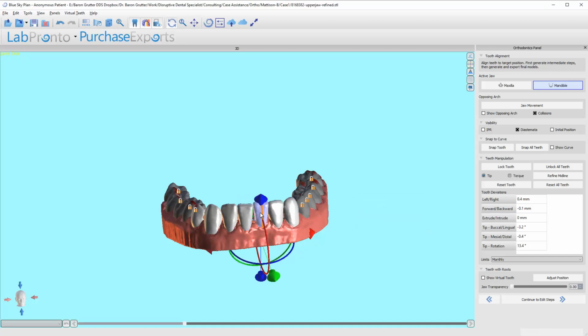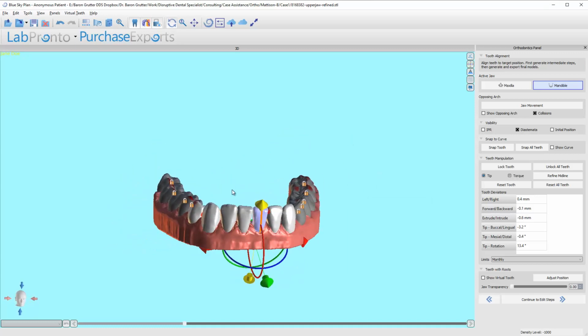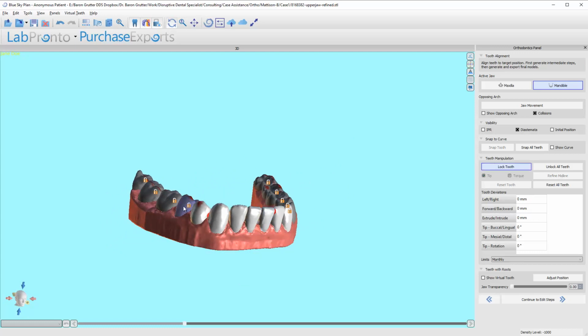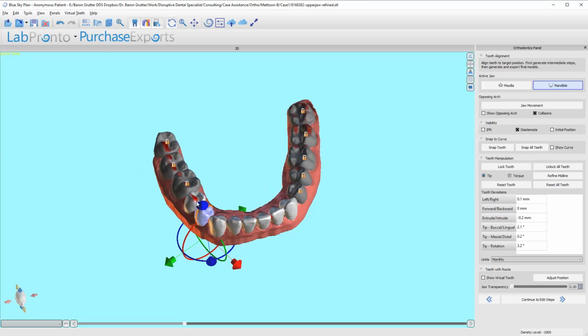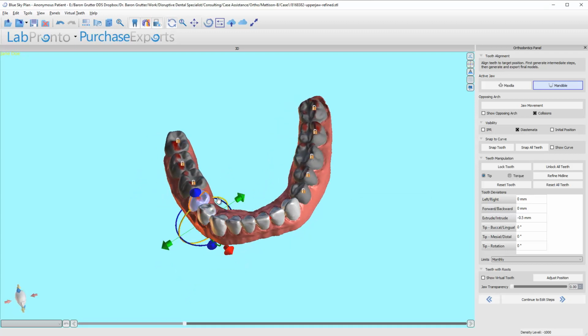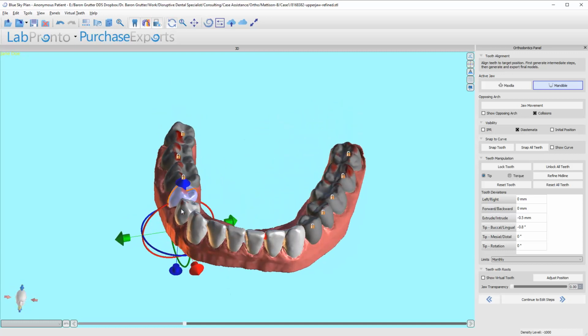So in a case like this, I'm going to be honest, I'm going to put buttons on almost every single tooth, because I want them to be very locked into these trays and move in mass. All of them move together. And one way to do that is to put buttons, because if one of them is going to not track, I want all the rest of them to move sort of the opposite direction, meaning it might require that as we are trying to intrude these teeth, these will extrude a little bit. And that's pretty common in bite leveling cases in orthodontics. That's very common, I should say.